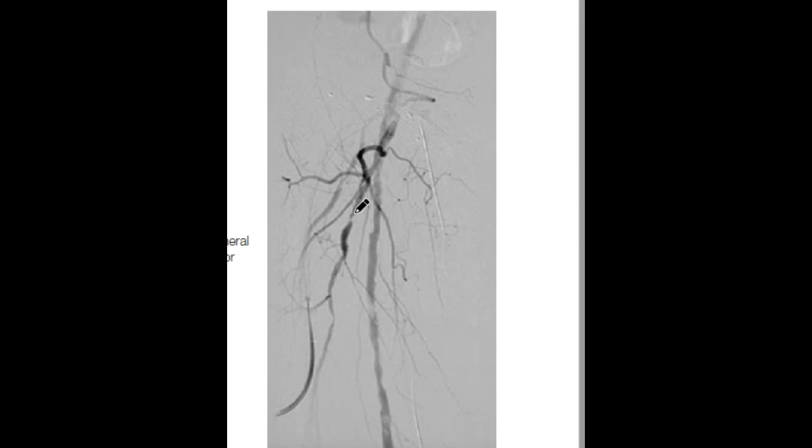If you see, this is also an angiogram, and here you can see it is markedly narrowed. So this is the femoral artery, and if you see here, there is narrowing of the artery. Here there is no flow of the contrast, and then here there is no flow of contrast properly. You can see the narrowing here. Here you can see the narrowing. So there are multiple thrombi which you can see in various branches of the femoral artery and also the femoral artery.